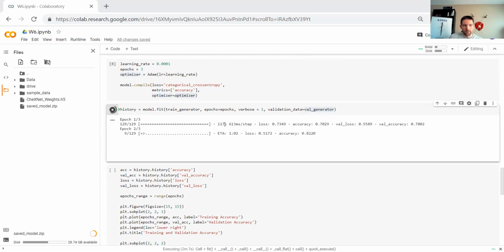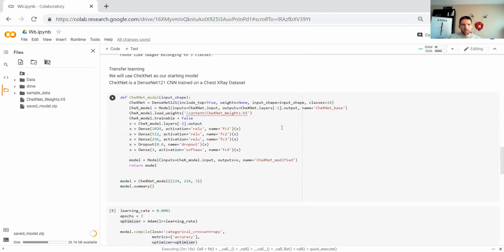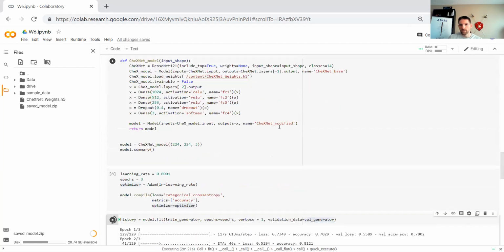Okay, so as you can see, our first epoch took about 2 minutes. So any published code can work here as a pre-trained model. Yeah, pretty much. If you can save, train, and load pre-trained models, and we're going to run through that in a bit. But yeah, you can copy and paste code. If the pre-trained weights are available, you can download those and apply them to the model.